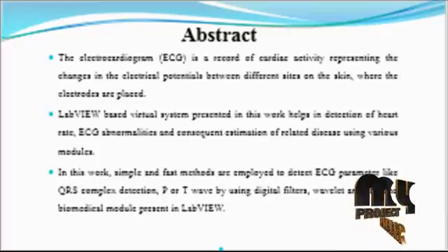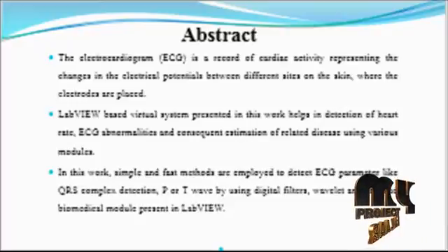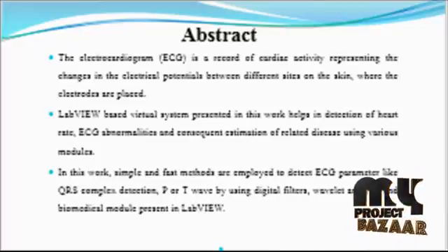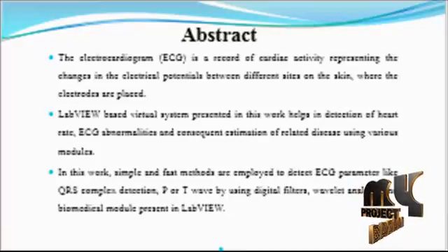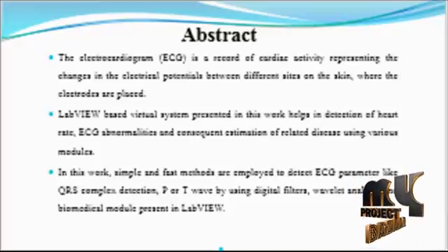The model's recording of ECG signal processing, display of heart rate, and possibility of relating disease have been designed using a LabVIEW virtual instrument. The designed system is advantageous in automatic removal of noise and accurate signal of the virtual cardiograph, and detection of the P wave, QRS complex, T wave and their onset and offset, along with the ST level elevation. This design has been tested on an ECG database obtained from PhysioNet.